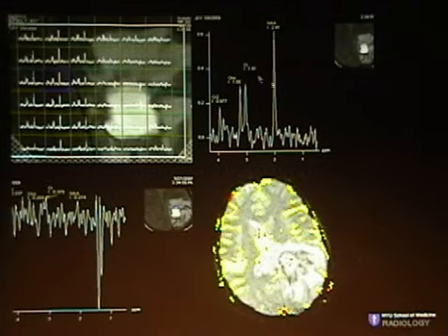So let's look at the MRS then. Here's a voxel within normal brain, and you see the normal NAA, normal choline, and normal creatine. And here's a voxel from the abnormal lesion. I've magnified this to show that there are no metabolites here. There is some lactate within the lesion, but generally when you look at the entire lesion itself, there is really no evidence of metabolites.